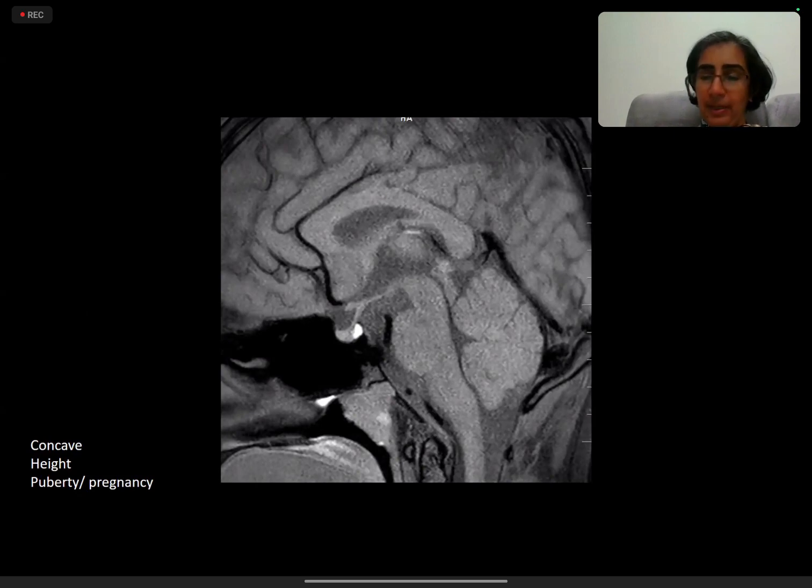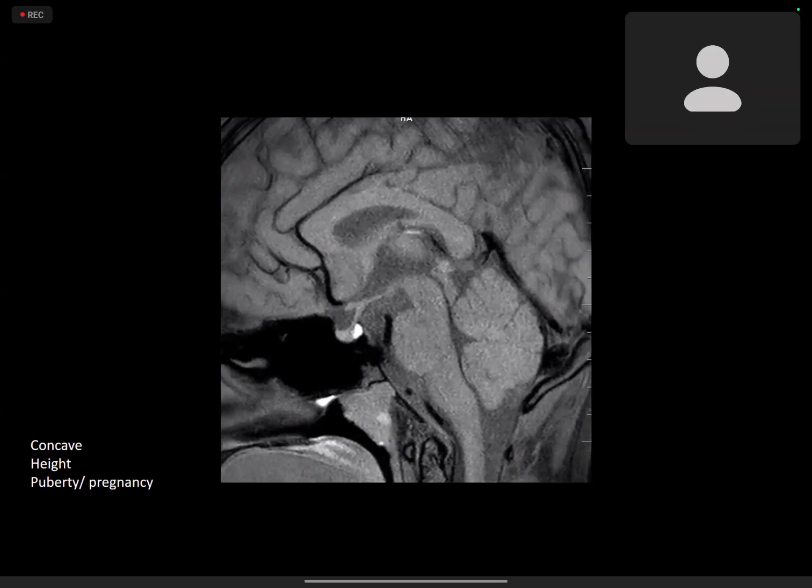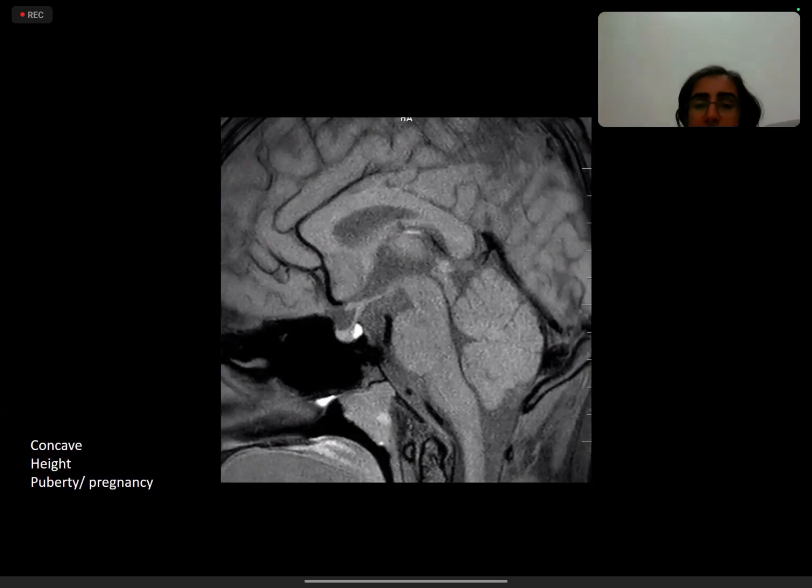Okay, now it's Avni's turn. Since Shwaks described the embryology, Avni will describe the parts of the anatomy. Please use the annotation to mark out the various areas that you are pointing out. Please point out the various normal anatomical landmarks on this mid-sagittal image.